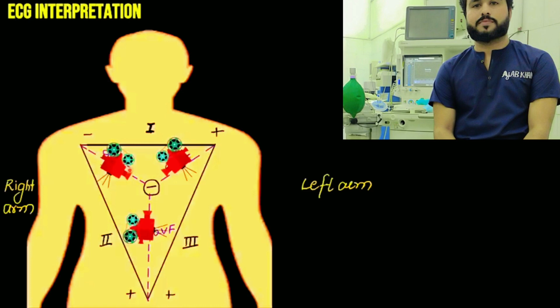So what the ECG machine did was increase the voltage so that we get a proper tracing on ECG paper. So these AVR, AVL, AVF leads are derived from these leads and their voltage is low. So we increase the voltage a little bit so that we get a proper, beautiful tracing on the ECG strip, and we get a different angle to look at the heart. That is called hexaxial leads.